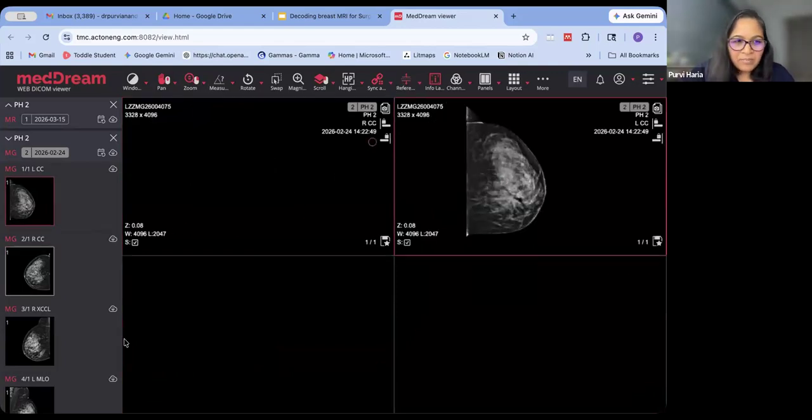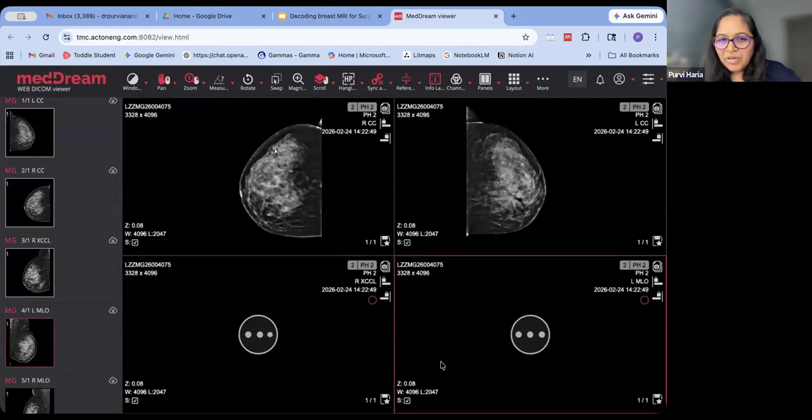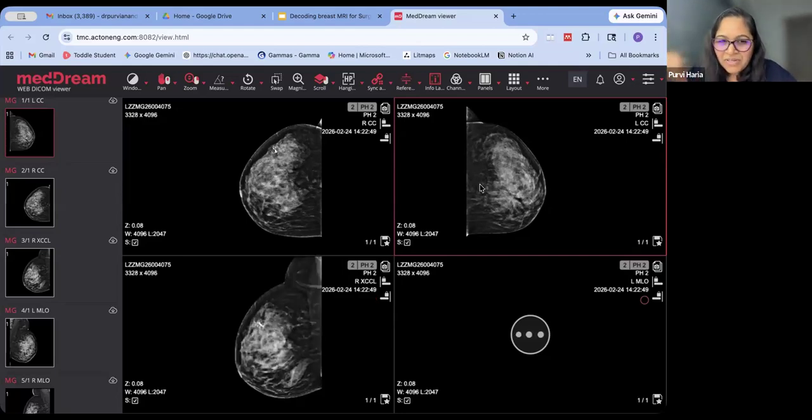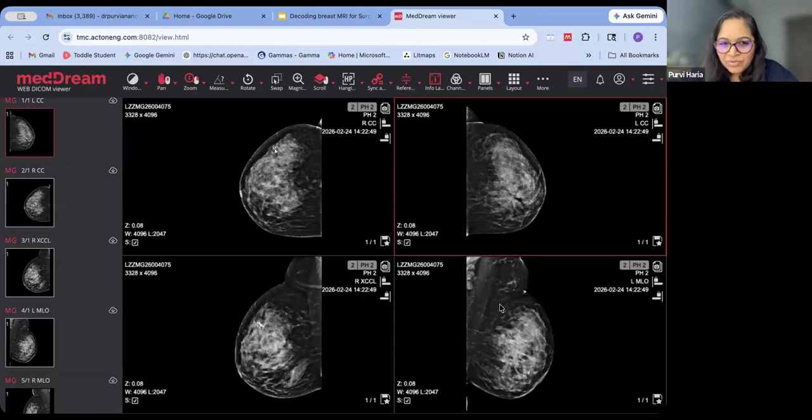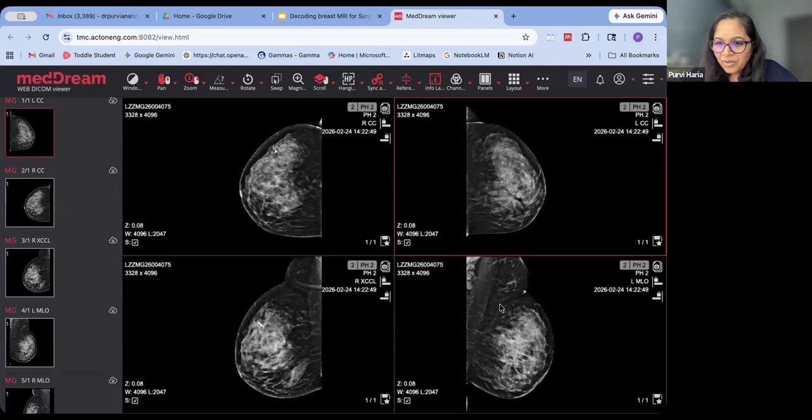So this is my mammogram. Why I got this is because, as we were discussing, Dr. Neeta, you are now maybe getting to see fewer films and more links on your devices. Everybody sends you those kinds of links. Yeah, it's often enough just a link that one is opening and going through. This is the same link that whenever we give it to the patient, we give the same link. So this is how you will see the mammo.